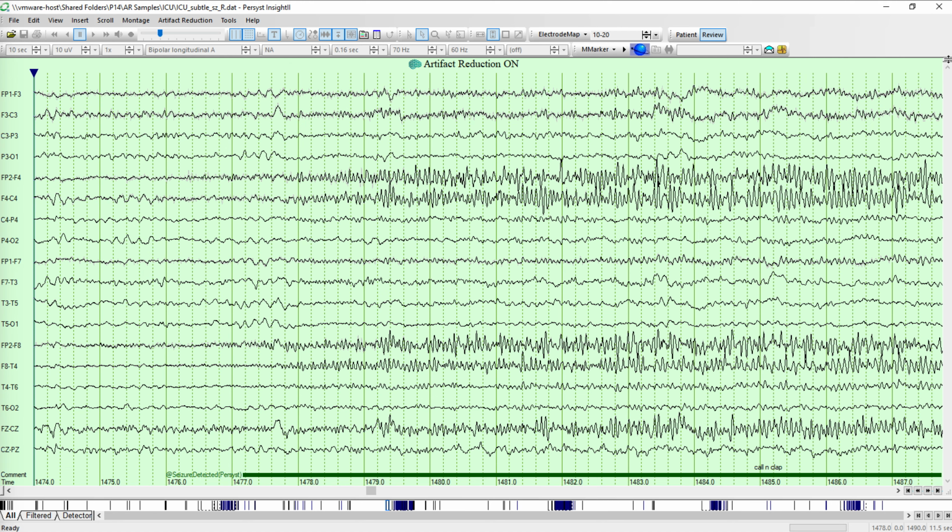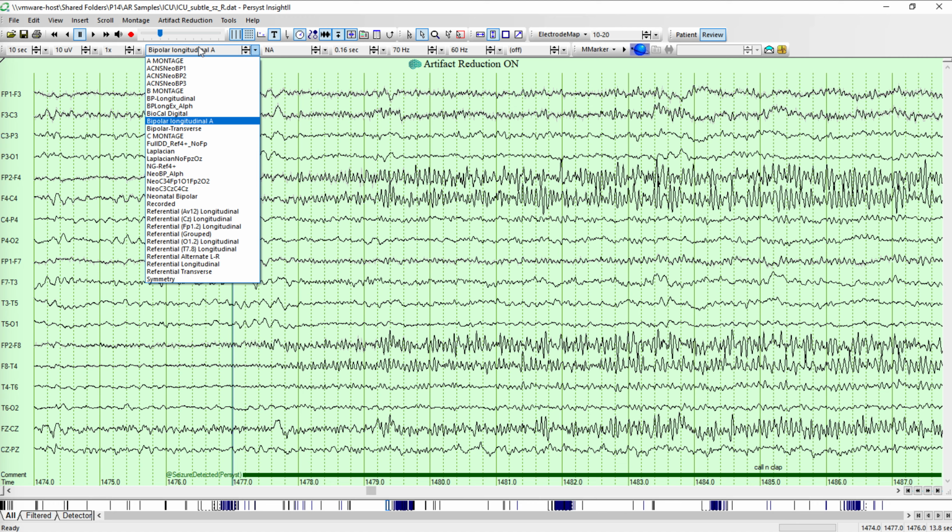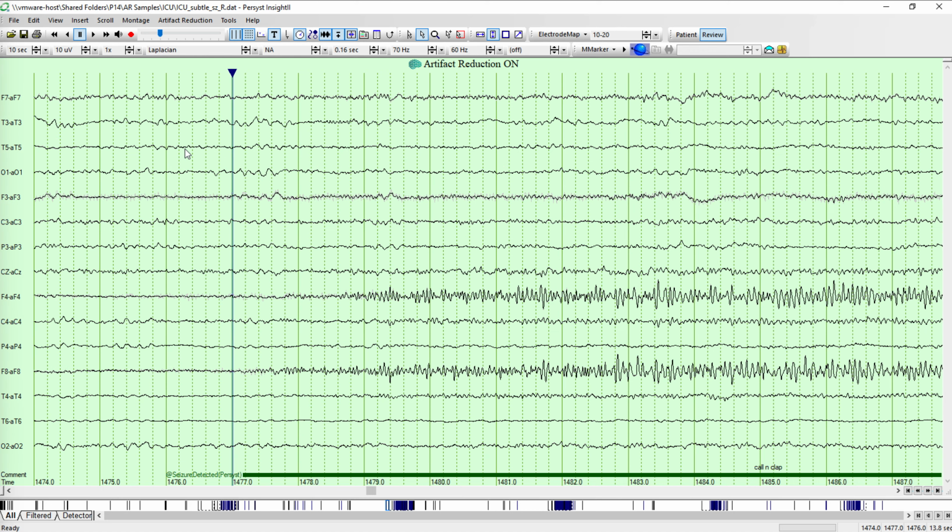I'm going to go ahead and close that box again just to move it off screen a bit. Now, this is a bipolar montage. We don't want to map a bipolar montage, typically, in almost all cases. And the reason for that is, imagine a topographic map you'd use for hiking through the mountains. If each point on the map was referenced to some other point on the mountain, it would be very difficult to make sense of it. And so topographic maps are usually referenced to height above sea level, and they draw those elevation lines.